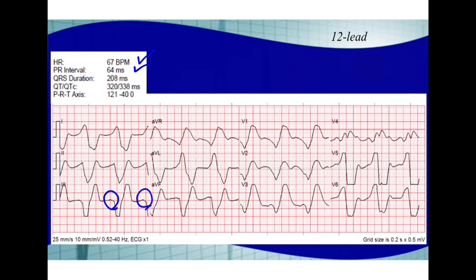If you were to look at lead I, for example, it's difficult to see where the QRS begins and ends, right? But look at aVL. In aVL, the QRS clearly begins right about here and ends right about there, and then you have a T wave right there. So first understand that this beat above that beat is the same beat as this beat, and that's the same beat as this beat. It's just taken from a different angle of view, right? Each lead is a different camera angle of the same beats. So all three of these beats occur at the same time.